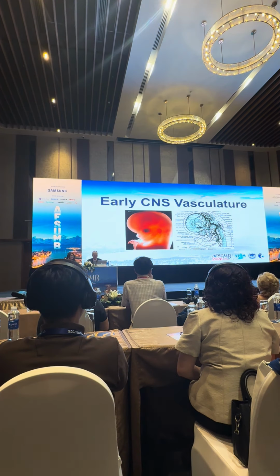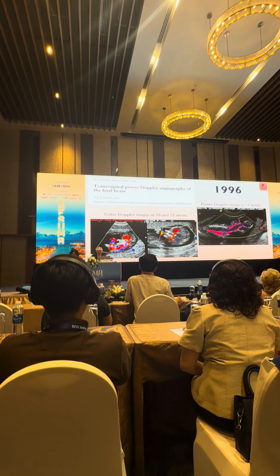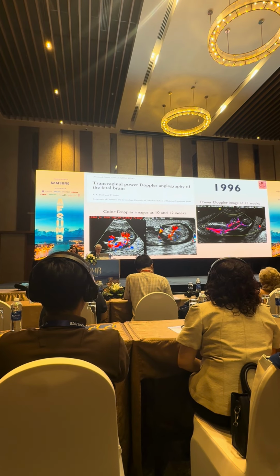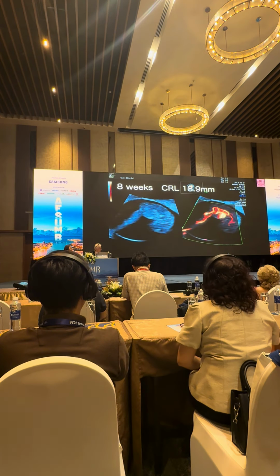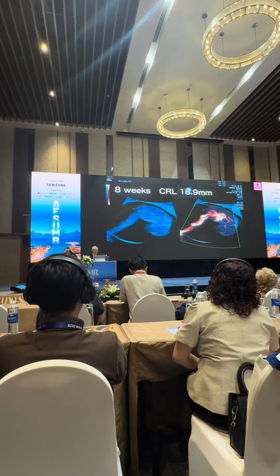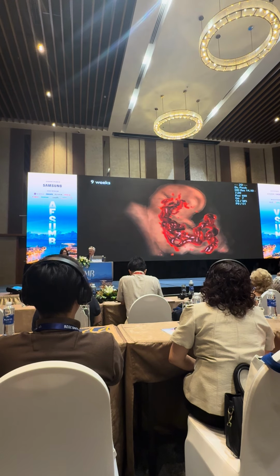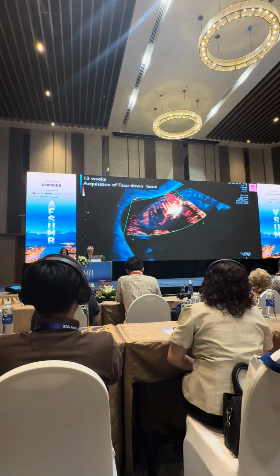And finally, early CNS vasculature. In 1996, I already published the transvaginal Doppler angiography of the brain at 10 weeks, 12 weeks, and 13 weeks of gestation. But recently, we can see many of the early pregnancy normal and abnormal vasculature.